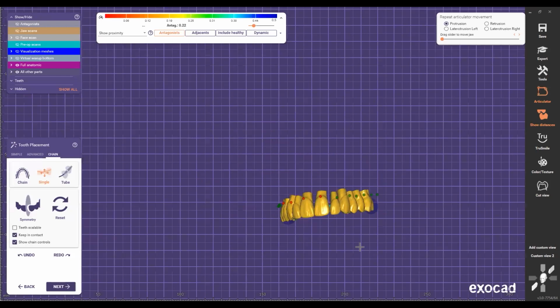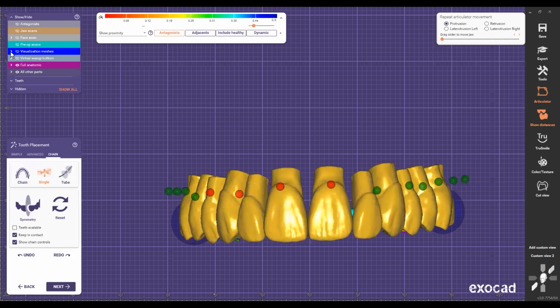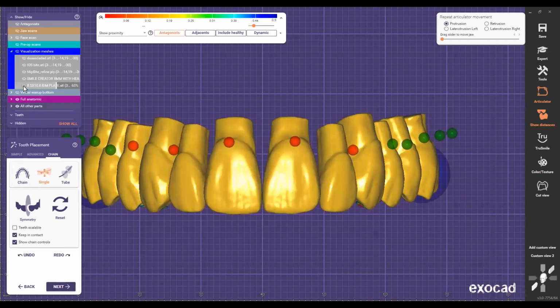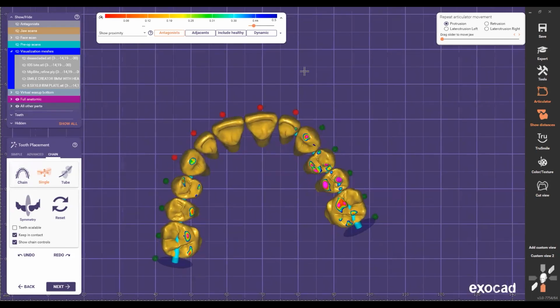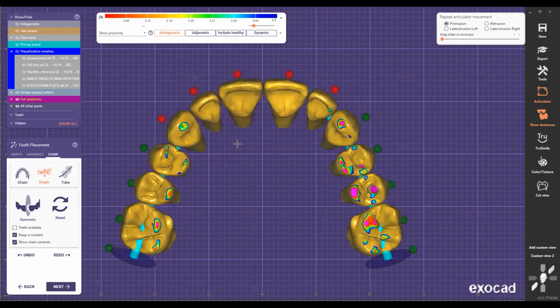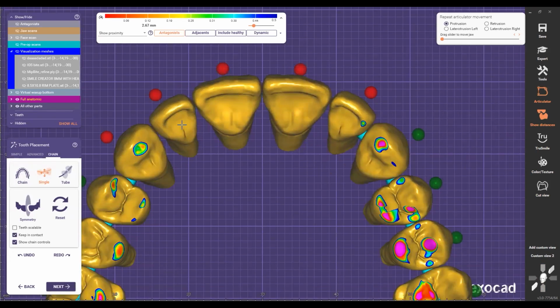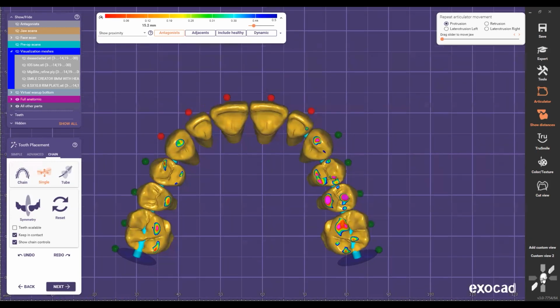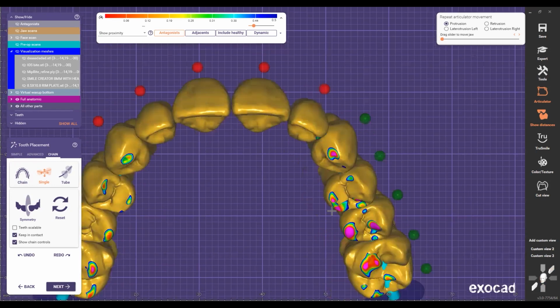It's already fixed. That tooth is in the wax, right? In the wax room. Remember, we have a digital wax room here, and that's basically what we're doing here, right? So now that tooth is locked. I'm gonna go from the top. I wanna make sure the curve looks good. I can just modify these teeth a little bit more right here and a little bit more right here, so the way they're gonna look better from the front. Okay, and same thing on this one. Once I'm happy with that one, then I'm gonna just jump to make sure I didn't move anything.